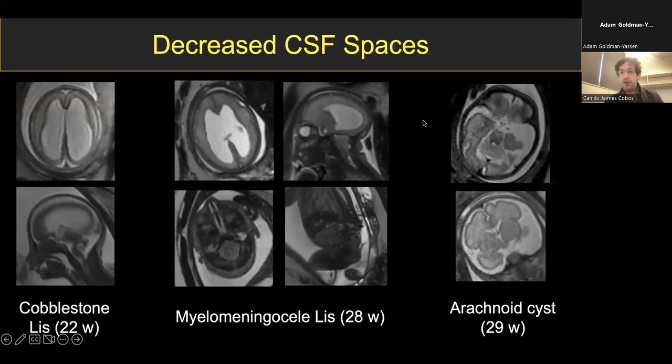deformities. The third thing I wanted to show you is an arachnoid cyst. So, garden variety arachnoid cyst, we see them not infrequently. And you can see there is an asymmetry in the left middle cranial fossa. And one thing I would say, and I think this is an important take-home point, is many of us have seen arachnoid cysts by the thousands. And in adults, they don't mean much. And in older children, they also don't mean much.